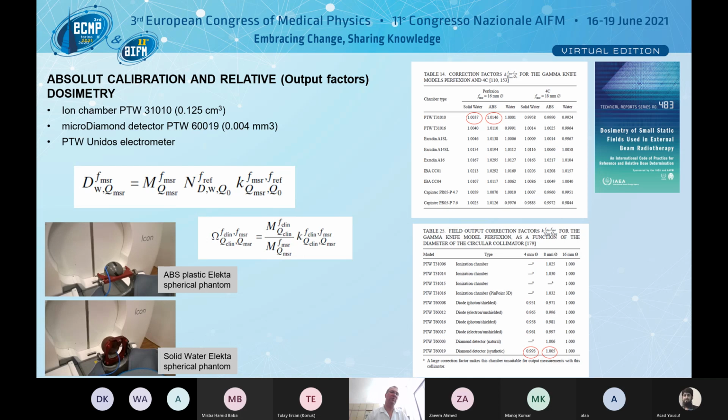This is the traditional way to calibrate, I would say, but recently, years ago, Elekta designed this dosimetry phantom, which is a solid water phantom. I definitely suggest, if you can, to use this phantom. It's a much better phantom. It's much better mimicking patient's fixation. It has smaller corrections and so on. So generally better, but it's a very expensive phantom, unfortunately.